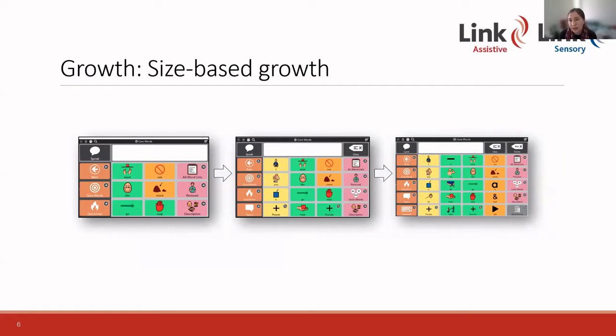So this essentially allows the learner to grow from a small number of buttons to smaller buttons. So in this approach, vocabulary is typically added to the outer edges of the grid to maintain the relative position of the vocabulary to each other. So if you have a look at want, like, not, and more in the images of the PowerPoint, and then also look at the addition of the pronouns to the edge and an additional row of vocab at the bottom between images 1 and 2.